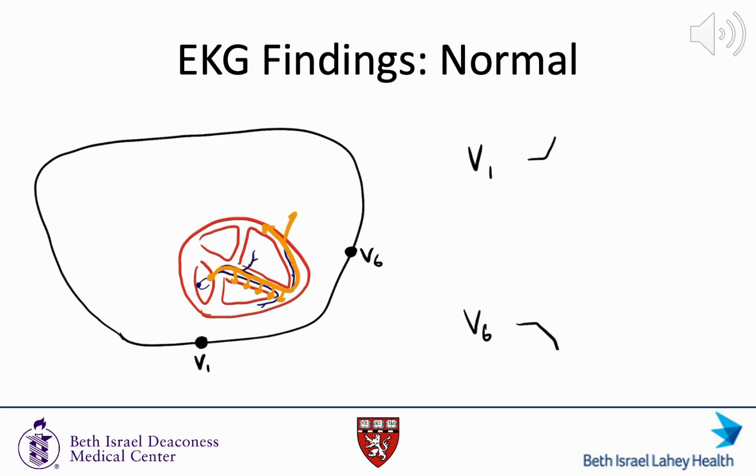But then very rapidly towards the left ventricular musculature, which dominates the EKG, which is much more muscular than the right ventricle, we see your electrical movement away really from V1 and towards V6. So you get the positive deflection in V6 and the negative deflection in V1. So it's really septal activation and then left ventricular domination of the electrical forces with very little seen from the right ventricle here.